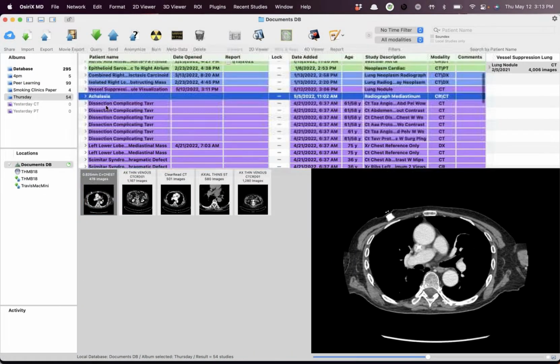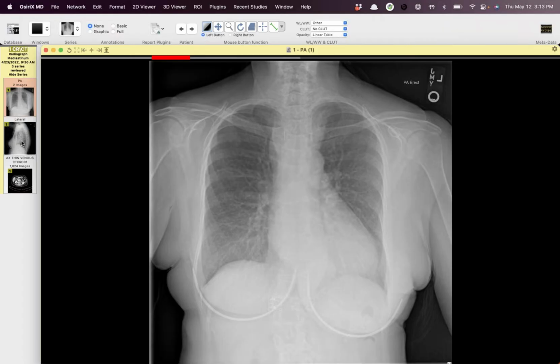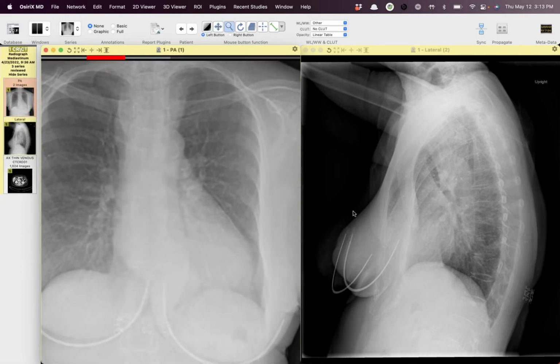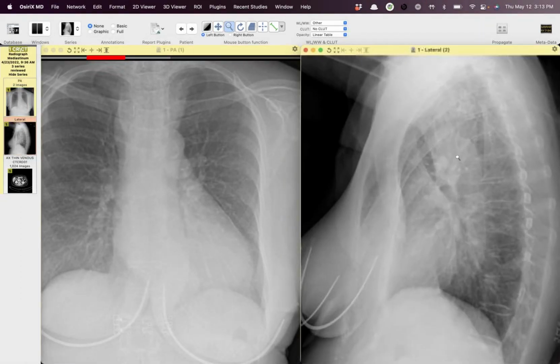All right. This one, I think, is just a nice radiograph, and one of the nicer lateral views, because you don't see the air fluid level, maybe a little bit here. But I think hopefully everybody recognizes that the retrotracheal space, or Raider's triangle, is opacified here. Not only that, the trachea is being displaced substantially anteriorly here. The trachea should probably be up more in here. When you see that, you think something is going on with the esophagus perhaps, or an aberrant vessel from the aorta. You can see a corresponding finding on the PA view.